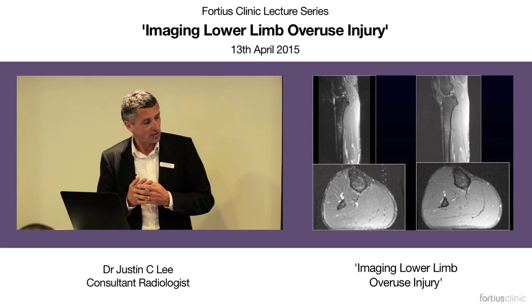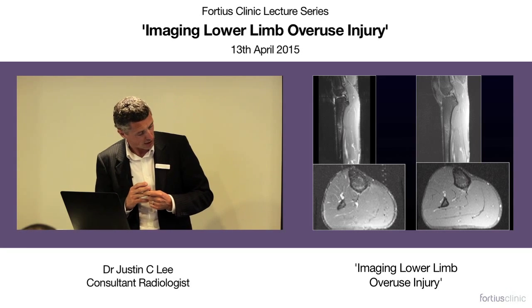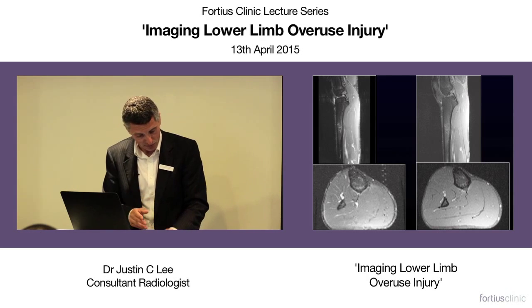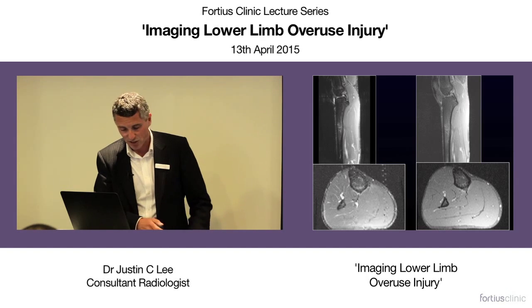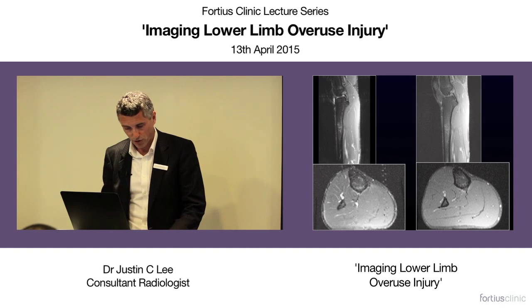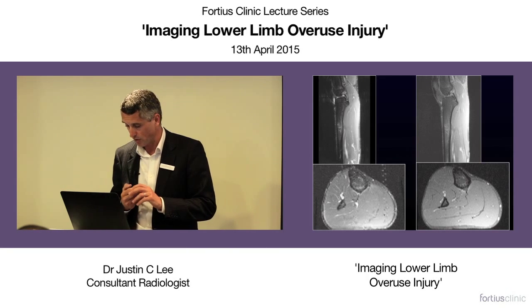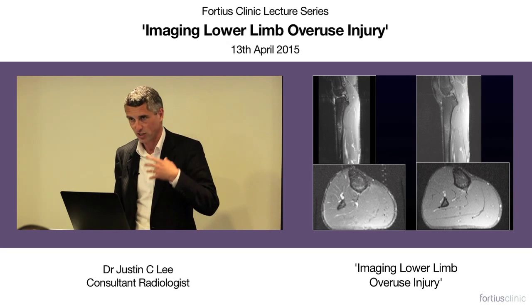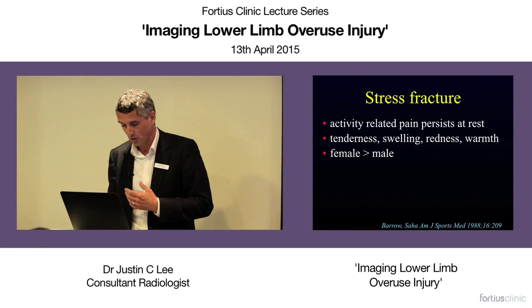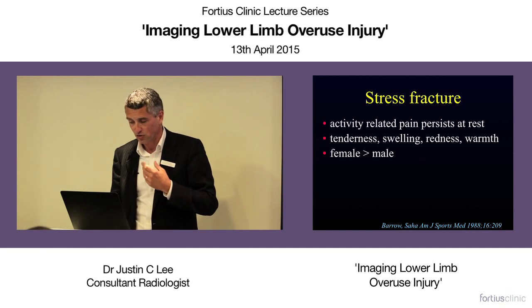Now, some people might refer to this as soleal tug syndrome, because you can see that that's the origin of the soleus muscle. It has three origins, actually: a tibial origin, a fibular origin, and a central non-bony origin. Some people might call it posterior shin splints, others might call it soleal tug syndrome, but essentially it's a repetitive overuse.